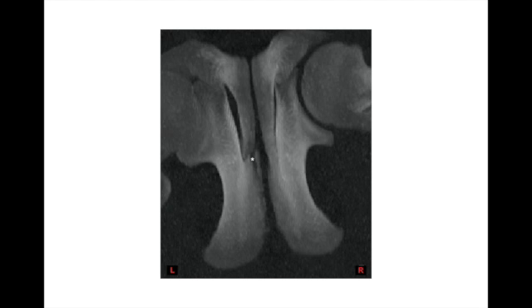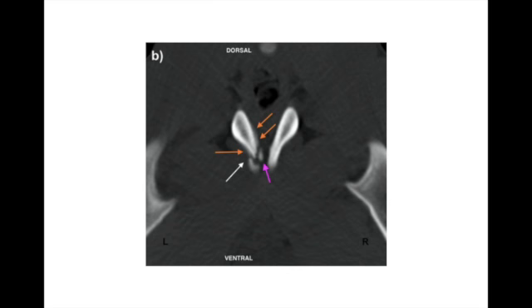This is a CT reconstructed image showing the closed, slightly displaced wedge-like fracture of the caudal ramus of the left pubis, with involvement of the medial ramus of the left ischium. From a transverse CT image at the level of the middle part of the pubic symphysis, bone discontinuity and fragmentation of the caudal ramus of the left pubis can be seen.